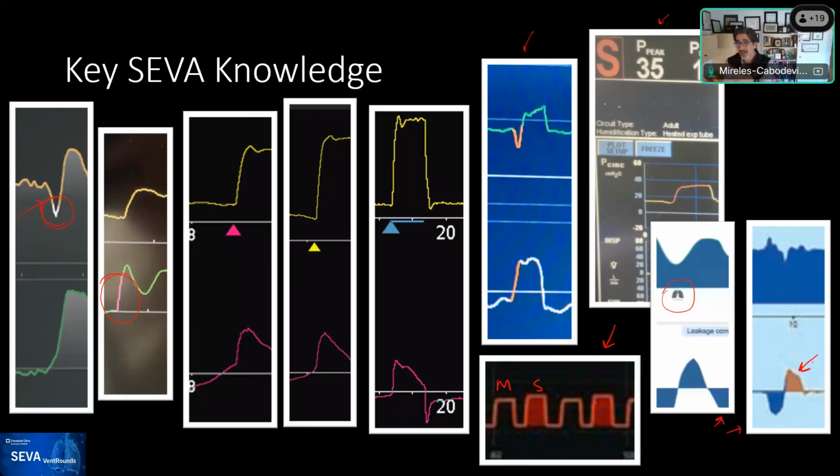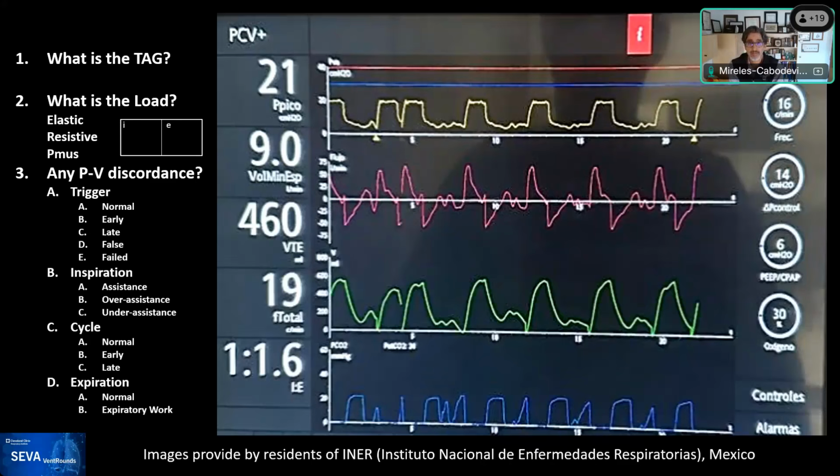And I did find sometimes in certain ventilators that I was looking at screenshots and it was evident that this was a patient triggered breath, but with no markers. And so then I was completely off, although that ventilator should have shown it. And I really do appreciate your comment about color blindness, because that's a major issue.